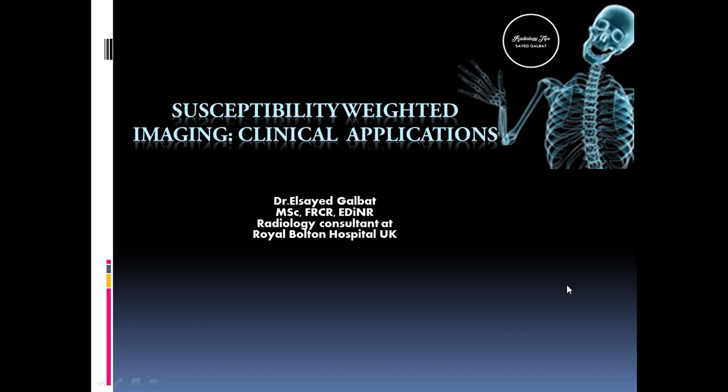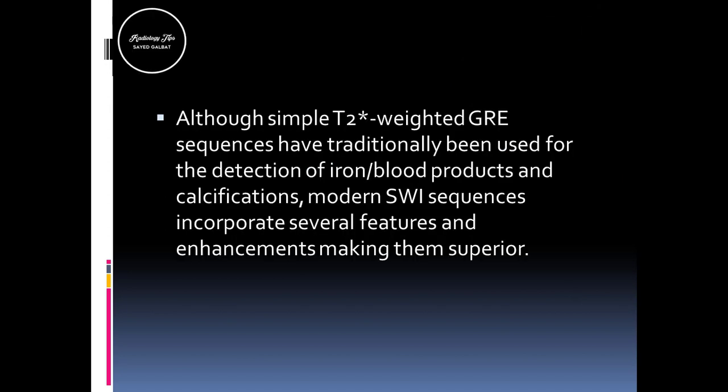Good day, everyone. Our talk today is about susceptibility-weighted imaging in terms of its clinical application. Although simple T2 star weighted gradient images have traditionally been used for the detection of iron, blood products and calcifications, modern SWI sequences have several features and enhancements making them superior.